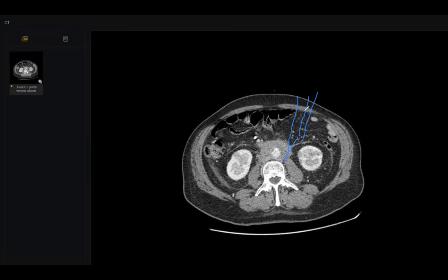This axis is very good and very accessible. Why? It is empty here: no bowel, no vessels. Even at the biopsy site here, it is very difficult to biopsy. By the way, any biopsy beside the aorta is very dangerous and must be done by a very professional interventional radiologist. But this question may be asked in the exam. Somebody may ask you to lie the patient prone and take from the back. Very difficult, very long. This is very easy.